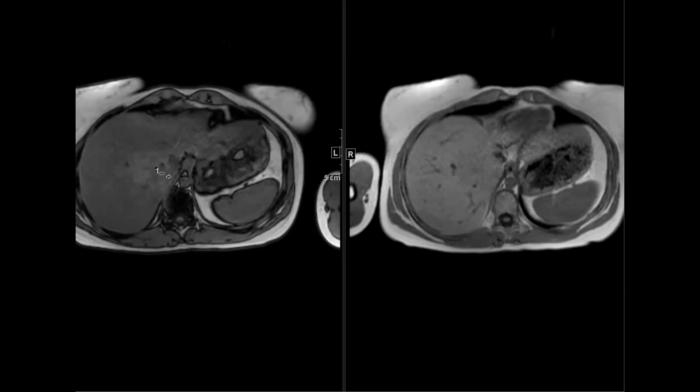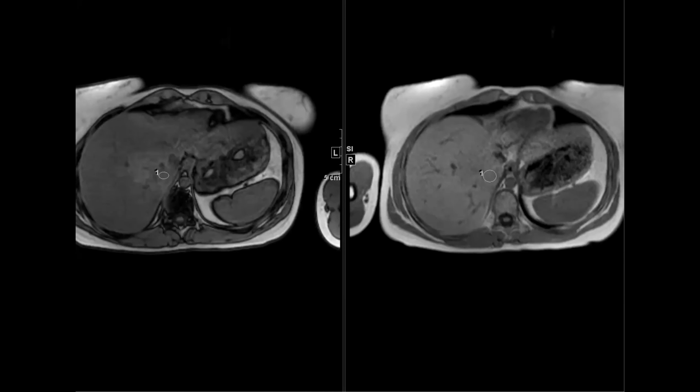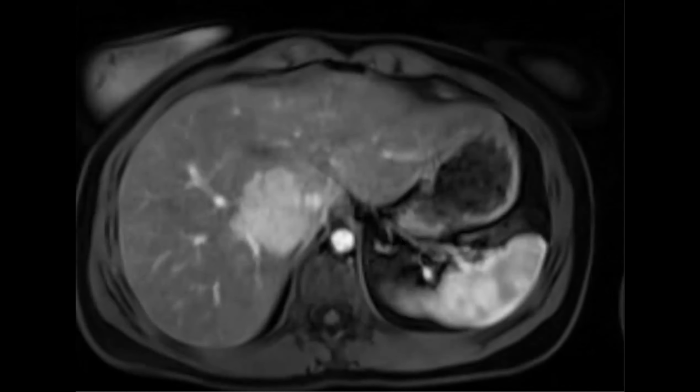Previously it was thought this could be an FNH. I mean, you would have to throw in HNF1 alpha adenoma. So it's going from 375 to 315 with a standard deviation of 20. So it's dropping at least 2 standard deviations. So there is some fat in it. But otherwise, it was looking very FNH. They were looking very FNH-y, right?